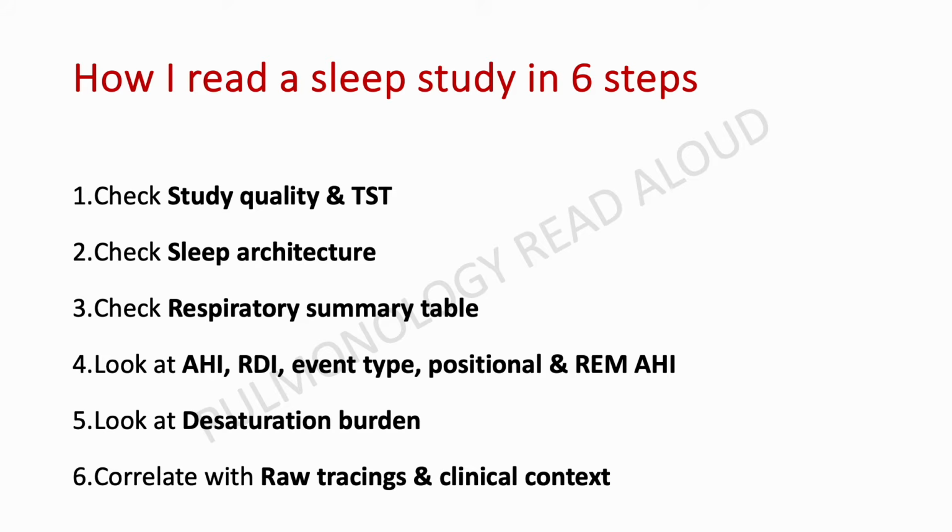And then I would never forget to go back and look at the raw tracings and ensure that whatever we have scored is correct, especially when it is not me who is scoring the report directly. If there is somebody else, a technician, scoring it on my behalf, I would go back and check the tracings to ensure that the final summary is with the right report. And don't forget to match it with the clinical context, because you may actually have unexpected results. So that's how you can formalize a plan to read a sleep study report.